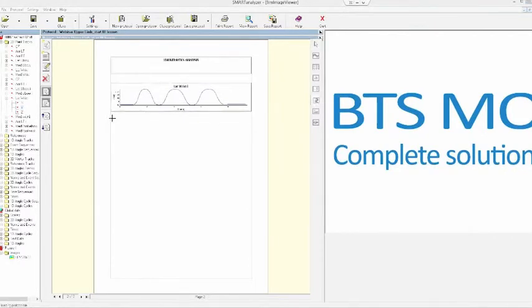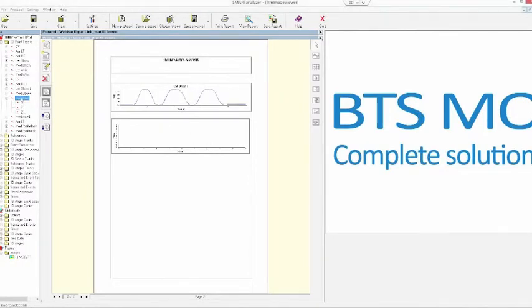Let me just show you. Okay, so I can create a second box. Okay, imagine that I want to plot the same variable, but now I will choose plot y versus x. This is the trajectory into a plane.